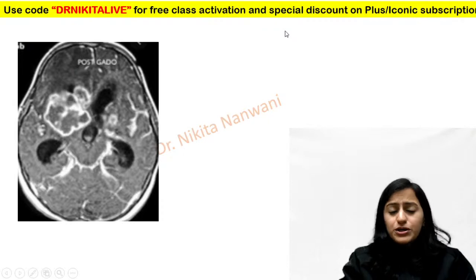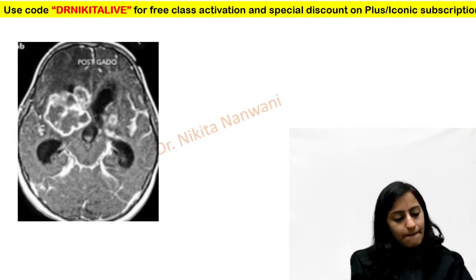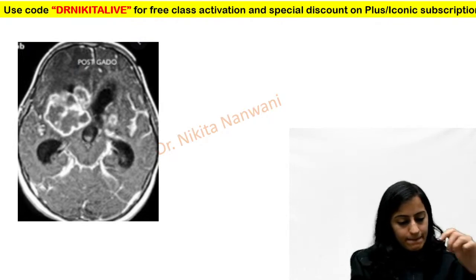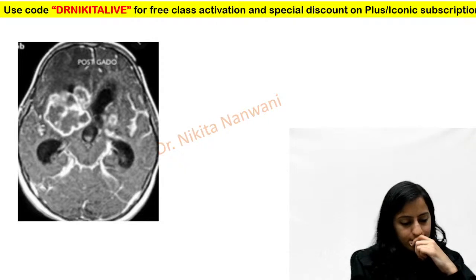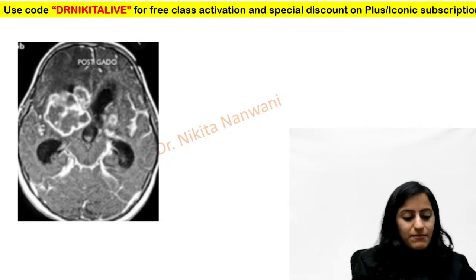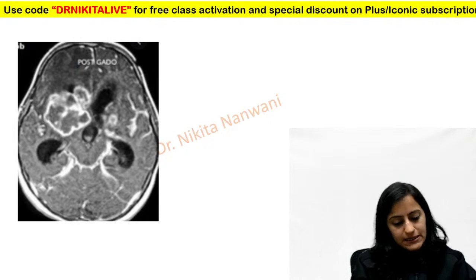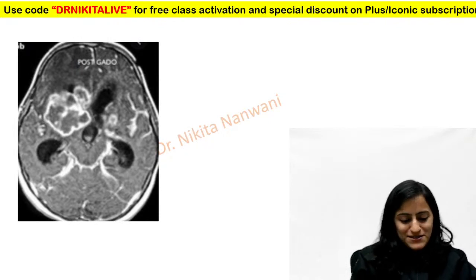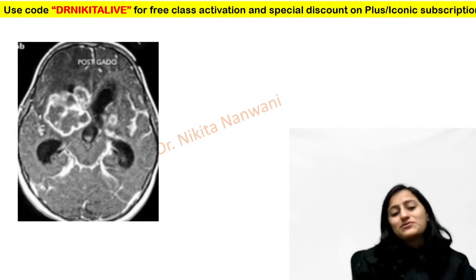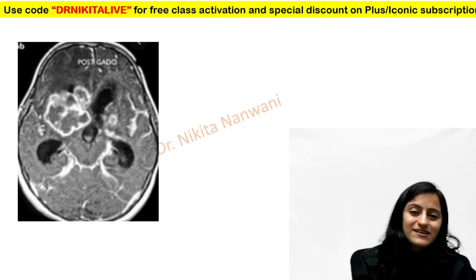All right. What do you think? Which infection is this? Very, very important. Which infection is this? Yes, Dr. Damal, in MR spectroscopy, in neurocysticercosis, we get multiple amino acids peak. Why do you call this toxoplasma? I see majority of you answering as toxo. Why do you call it toxo? It's not toxo. It is the most common infection that we see in our country.